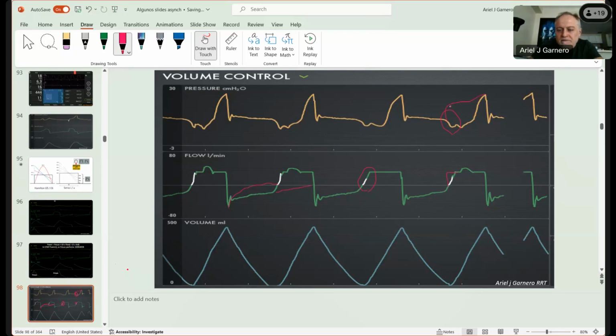On most ventilators, you can adjust the rise time, but only for the pressure waveform. The Servo is different because you can adjust the rise time and the fall time for the flow waveform. You can probably generate an infinite variety of flow wave shapes, which makes interpretation a little bit more difficult.